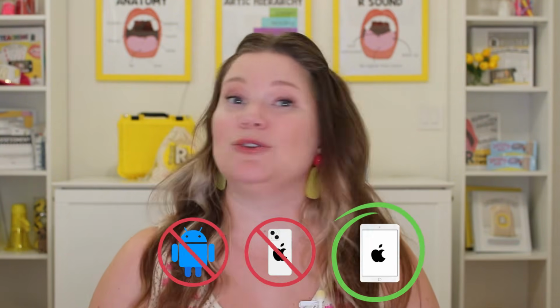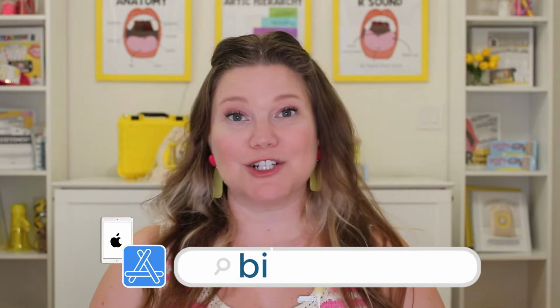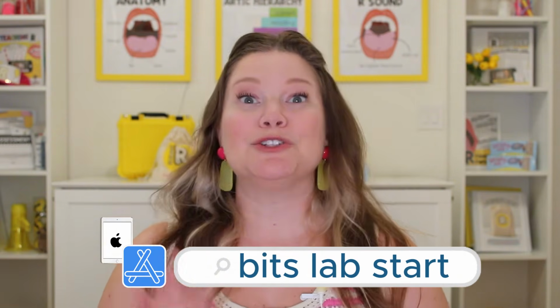And please note, I do mean iPad app. You cannot use it on any other tablet. You cannot use it on iPhone. To find it, pick up your iPad and go to the iOS App Store. You're going to type into the search BitslabStart. You'll know it's the right one when you see this cute little starfish.